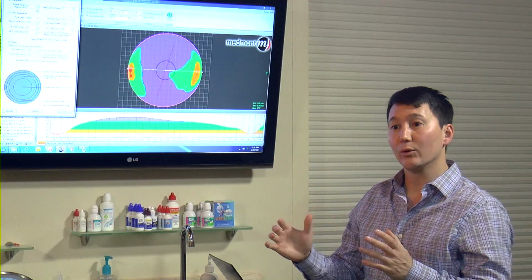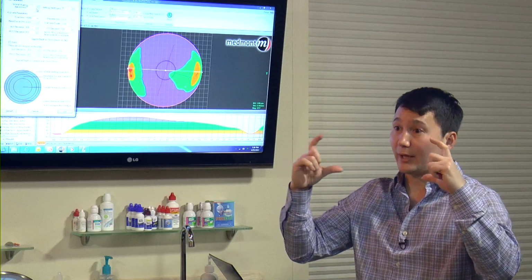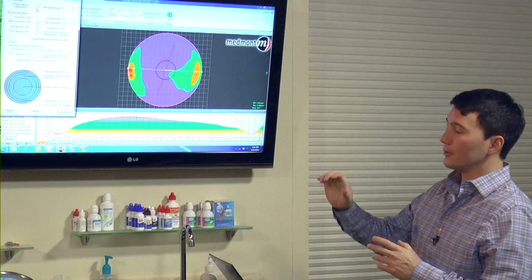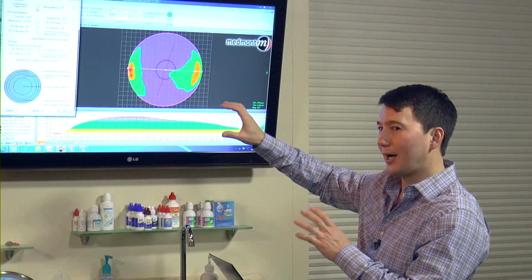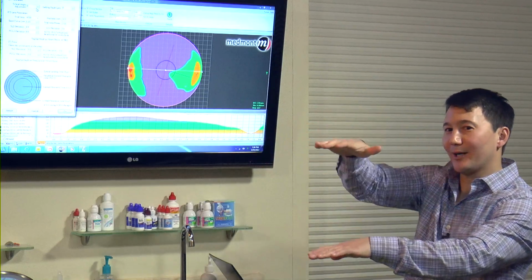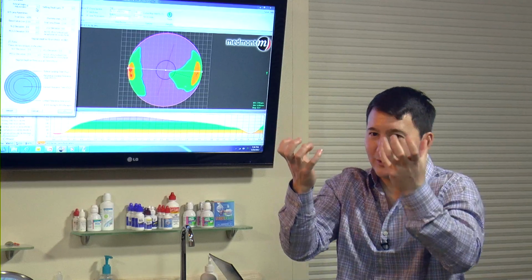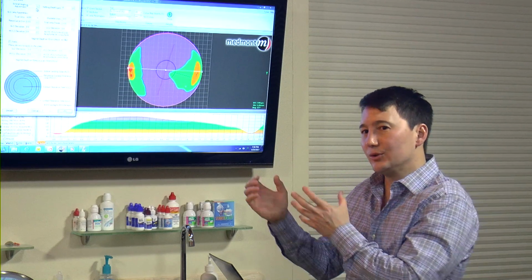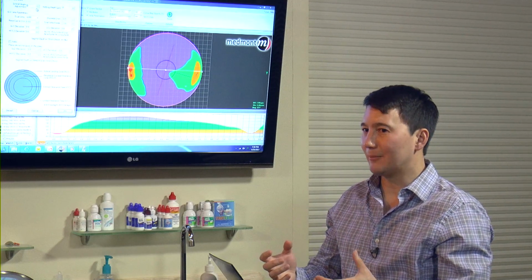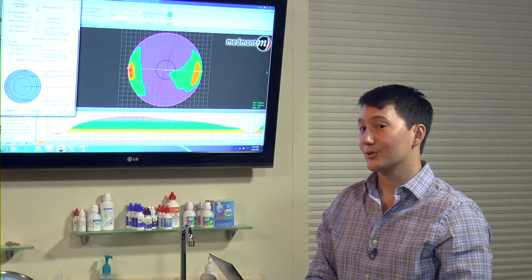This is looking good. We don't expect this patient has one of those weird high angles like I have, where there's going to be a real elevated point near the limbus. So the standard lens probably looks like it has hope. Now, scleral lenses don't sit up high and proud like this, landing on the surface way up on top of the conj. And with those big goblet cells, those lenses just sink right in. So using this little theoretical model is really only helpful in terms of picking a lens that might start with the right apical clearance. So what if it settles?